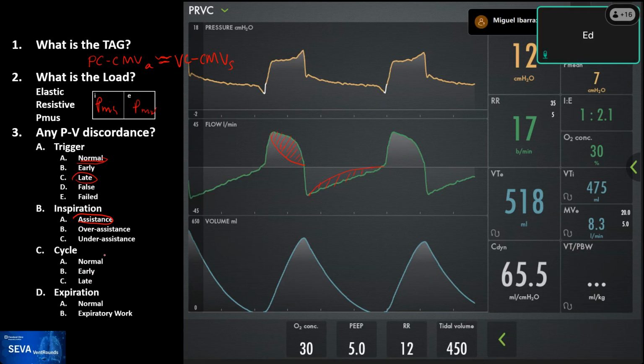Yeah, so the literature and the way that we have been classifying is that it's normal because there's no effect in the flow. There's no evidence of a step up or that it affects the expiratory flow, and that this may be just the way that the ventilator doesn't have chance to adjust the pressure to achieve it.